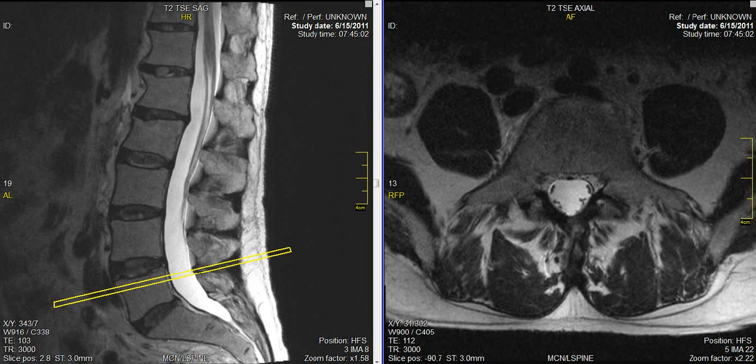Okay, we're going to review an MRI scan of the lumbar spine here to demonstrate how we can review the normal anatomy of the spine using the MRI. And we're going to use the computer-based PAC system that we typically use instead of film nowadays, and this is the way the images are provided. It's a nice way to organize the films, but it also allows us to do some things that really demonstrate the anatomy in 3 dimensions much more clearly.